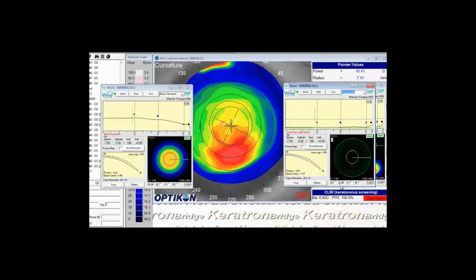The reason is when you select GSIM, you're telling the software that this cornea is a symmetric object, even though it's not. So the software is analyzing these curves to find a best fit overall because it thinks it's mostly symmetric. On most cylinder cases, you can select GSIM even though it's not 100% accurate. It still gives you a very good contact lens fit. And it's a more simple design. And we always go with a simple design because simple designs usually work better when they're well suited for the cornea. So on a cornea like this where it truly is not a symmetric cornea, do not select GSIM.